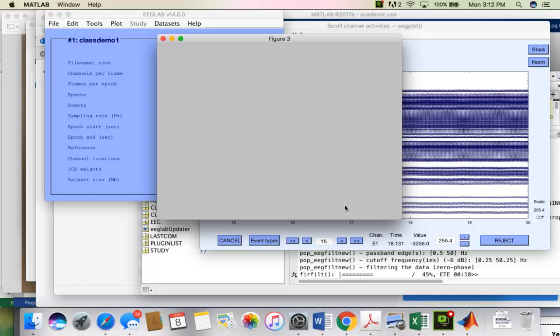So it's a high order filter, and it's having to calculate the digital filter components. So that's what the system is doing right now while we wait. It's much longer on the low frequency end than on the high frequency end. So we're just going to hang on.